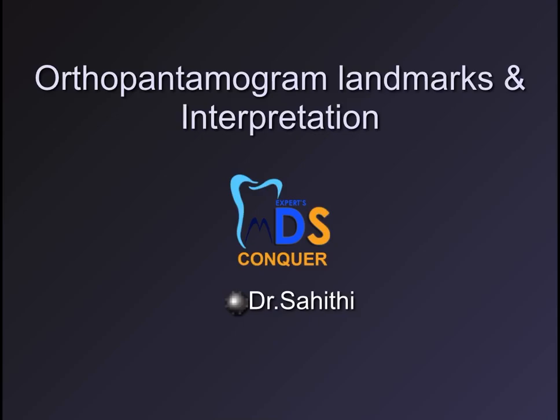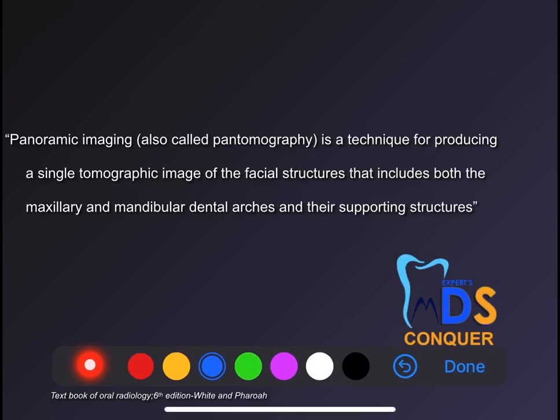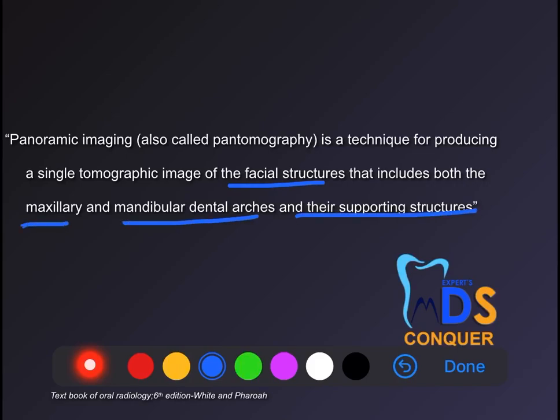So the next topic that I'm going to discuss now is the landmarks and interpretation of the OPG, or the orthopantomogram. Panoramic imaging is a technique which produces a single tomographic image which includes the facial structures of both maxilla and mandible dental arches along with the supporting structures. So I think you are pretty aware of it.